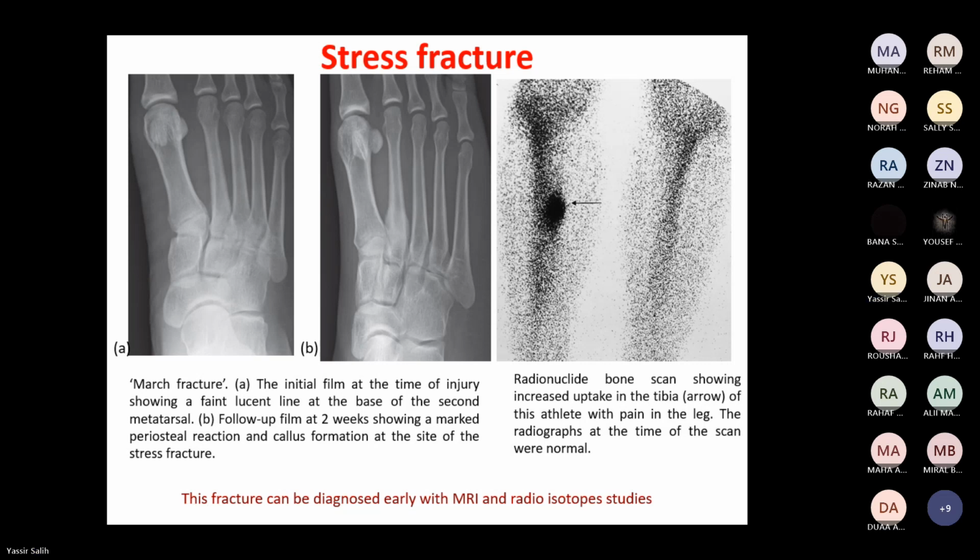So pay attention, there is a fracture here that was missed in the first film. If it was reported as normal, we now know there is a fracture here. The fracture has now healed. So this is a stress fracture. Usually this is the scenario for a stress fracture.